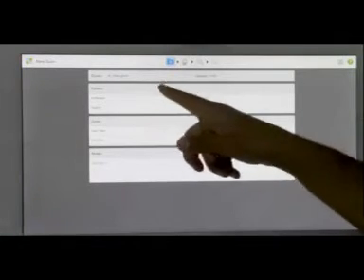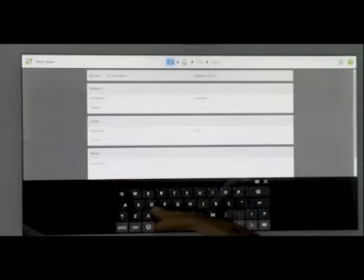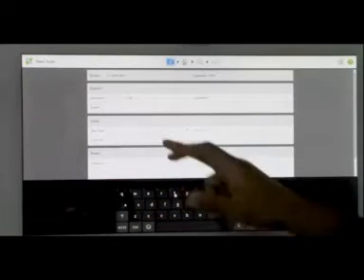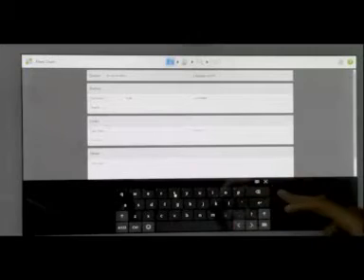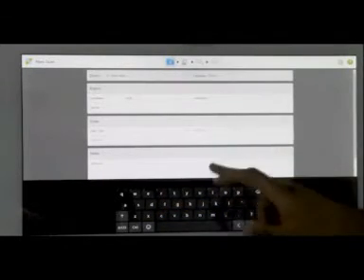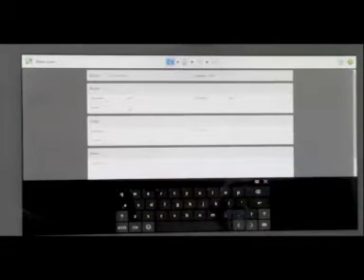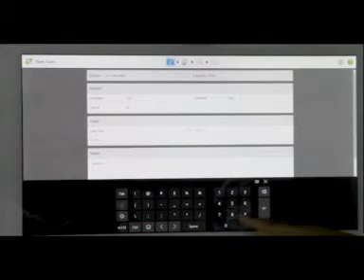Okay, so it's loaded Dr. Nazar, which is great. Then we're just going to enter test. It will be the patient's first name, and then last name. And let's say you've seen this patient before, or there's someone with the same name as someone else, you can add a birth date here to just separate.